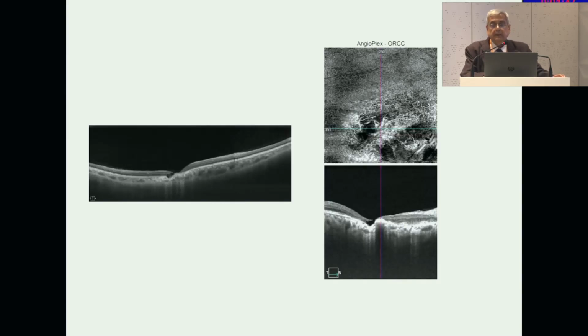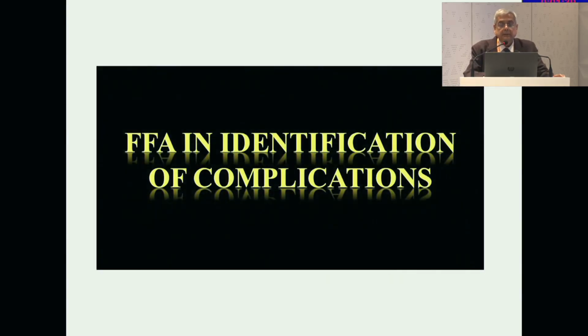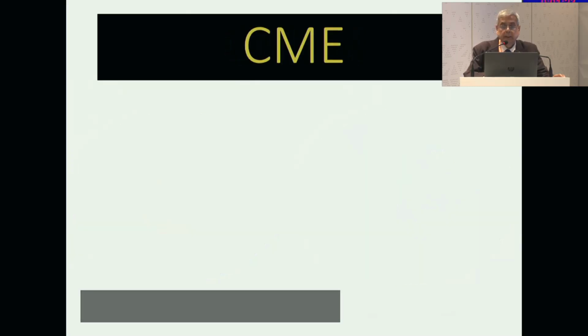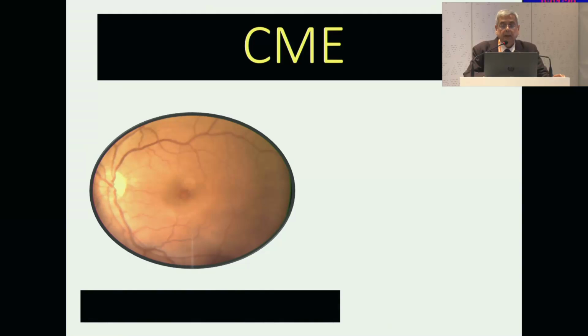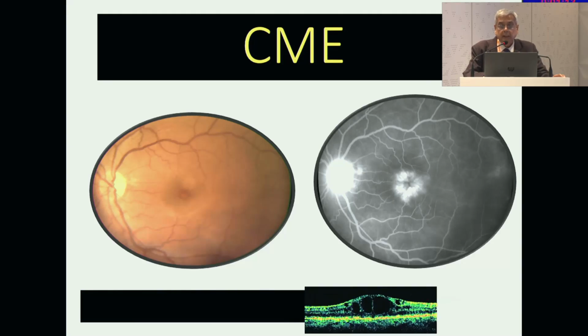And this has been seen over the area, over the OCT. And there are complications. Here is a case of choroidal scar, and you can see this bleed with a little SRF, and the late fundus fluorescein angiogram showed the membrane there, which is hyperfluorescent. In case of cystoid macular edema, if we are able to do a fundus fluorescein angiogram, you can see the petaloid hyperfluorescence, and this can obviously be seen with optical coherence tomography.